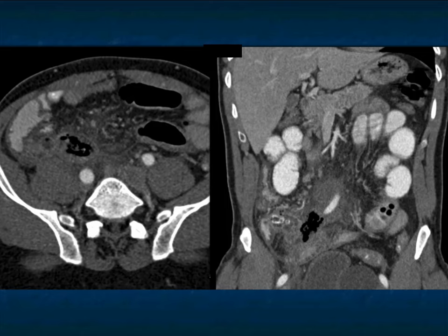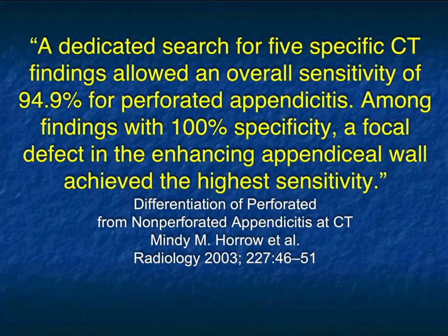And again, the question about oral contrast for appendix. In the early days of CT, you would give patients oral contrast and wait 3 hours. The surgeon didn't like that, but at least you didn't have to come in to read the scan. It was a great delaying tactic. These days, nobody wants to wait more than 30 minutes, if they want to wait at all. You can give positive oral contrast, which can be helpful if you need delayed scans. But most of the time now we use water and we're able to make the diagnosis. In this case, you can see the dilated small bowel, the inflammation, the dilated appendix.